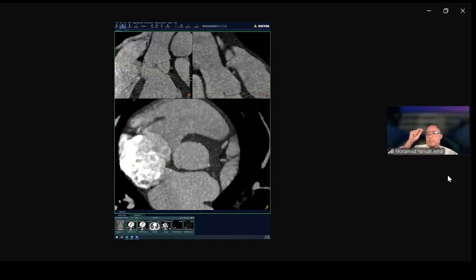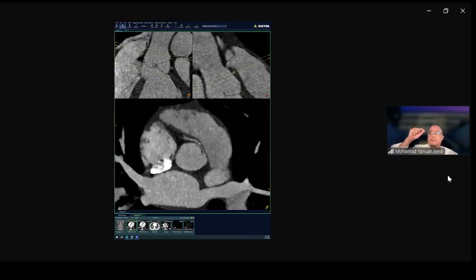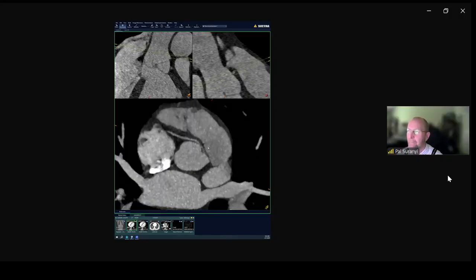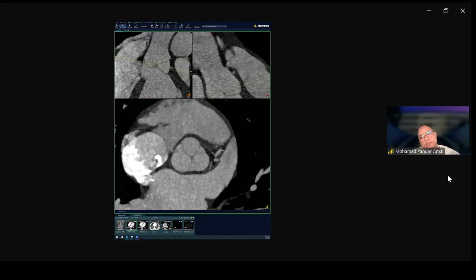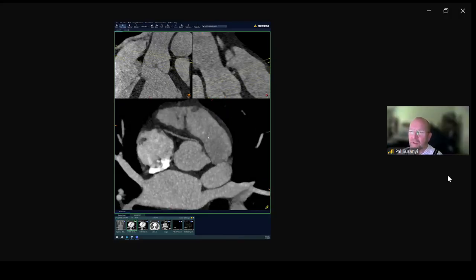So the interarterial course of the coronary artery is below the pulmonary valve. Yeah. So it would be coming here. Yes. Maybe, I mean, obviously it's important to describe. I'm not sure exactly what you're getting to.